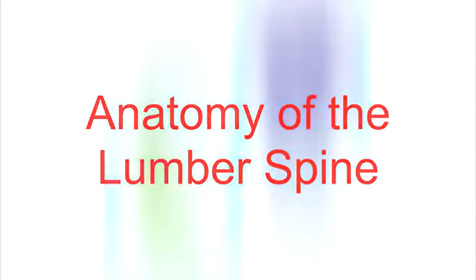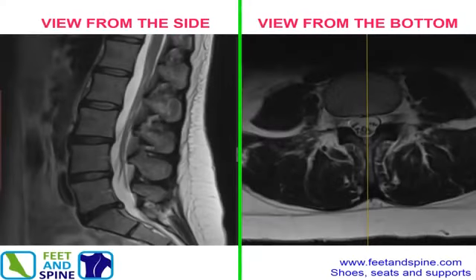Anatomy of the lumbar spine, interpretation of MRI scan of the lower back. This is a short presentation on how MRI scans of the lumbar spine can be interpreted after having performed the investigation following an episode of chronic lower back pain when caused by disc degeneration.